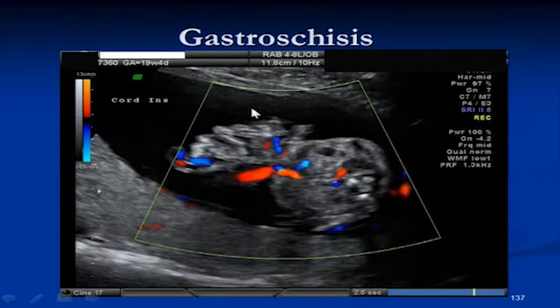All right, omphalocele. Everything we said about gastroschisis, we'll say the opposite of it with the omphalocele, which means that instead of the cord inserting normally into the abdomen, the cord is abnormally inserted into the defect, actually inserted into a membrane. So the lesion is, instead of being paraumbilical, umbilical. It's right in the umbilical area.